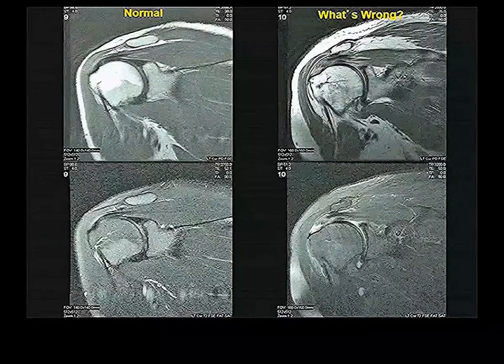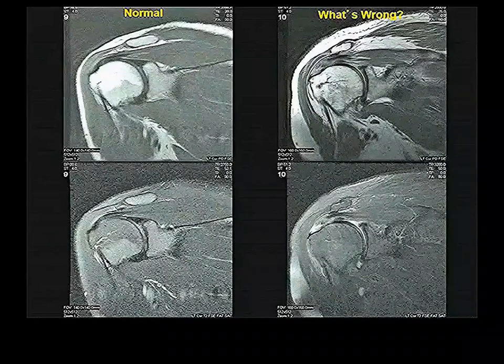Well, why don't you take a look at the muscle that inserts right on the apex of the greater tubercle of the humerus? Do you know the name of the muscle that inserts on the apex of the greater tubercle of the humerus? Somebody must know. Very good. Thank you. Supraspinatus.